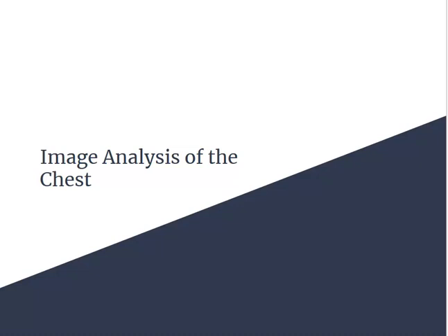Welcome to the image analysis of the chest. Today we will go over image analysis guidelines for chest projections of the PA, lateral, and decubitus chest. We'll also review common positioning errors and ways to take corrective action.